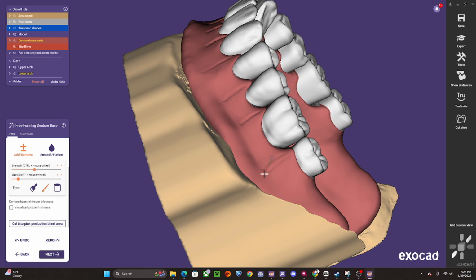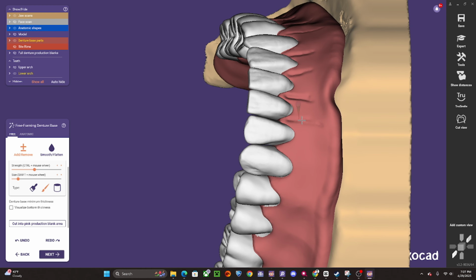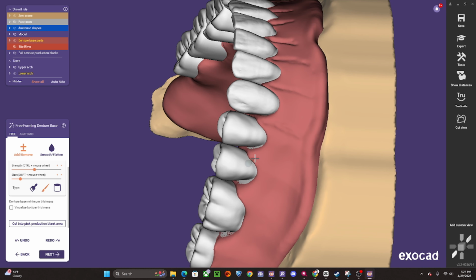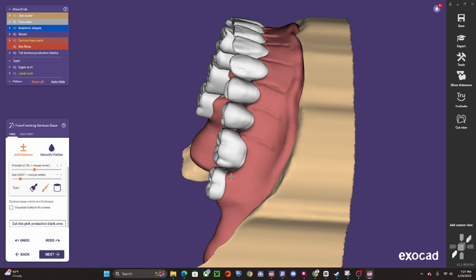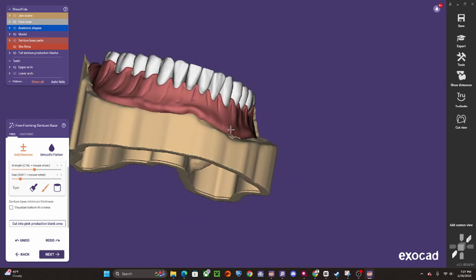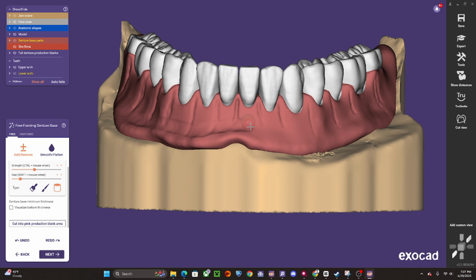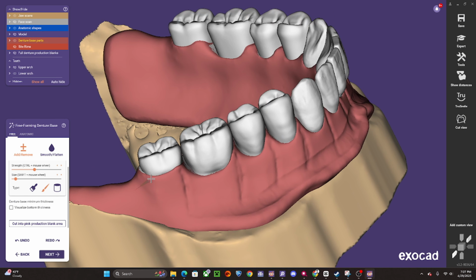It starts with our initial lines right in the interproximal areas, which are your valleys. And then we do have peaks that we want to accentuate, as well as remove from this area as well. And then define the cervical.